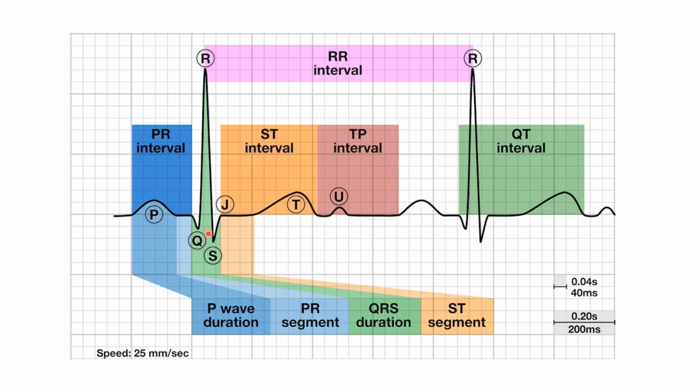You've heard of a myocardial infarction, like a STEMI. It's an elevated ST segment. So if you look here at our ST segment, this is this light orange and you follow it. This is here right at the end of the QRS wave to the beginning of the T wave. So you see it's flat. We're looking at a normal sinus rhythm. It should be flat.